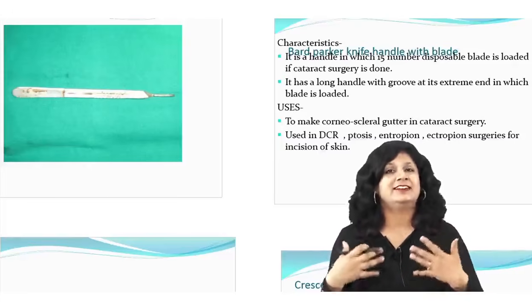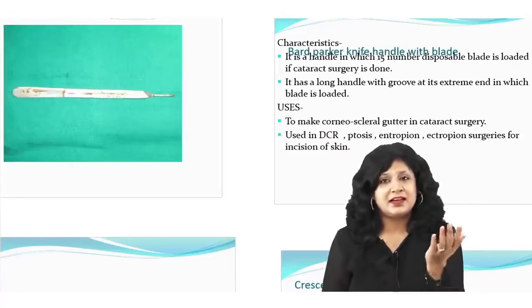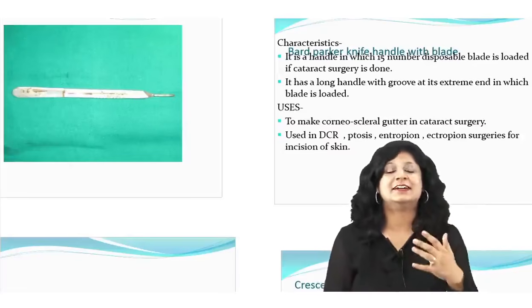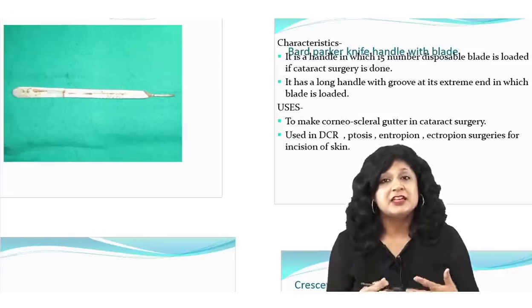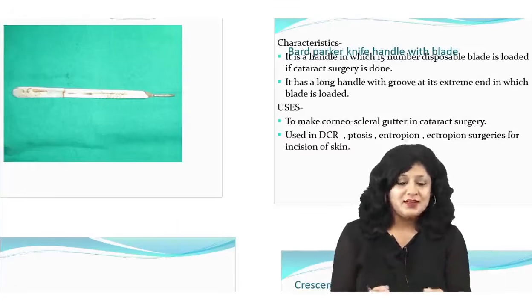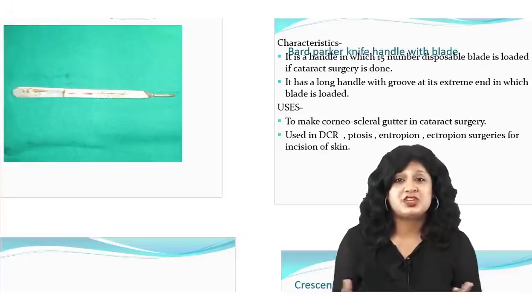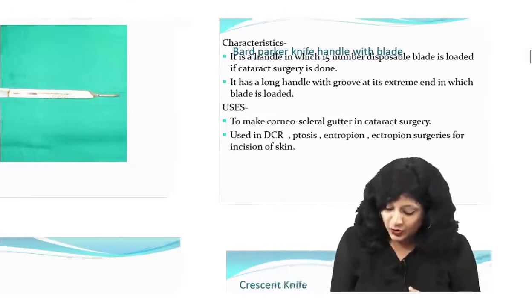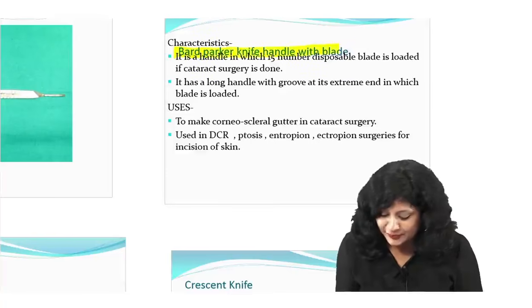From there we start feeling that yes, we are a medico, and a lot of people get a kind of shock from this. We have seen so many people getting a syncopal attack on the dissection table, seeing these blades, or when they see blood shedding in the OTs for the first time. So this scalpel and blade, how you are using it, this is called the Bard-Parker knife handle with a blade.